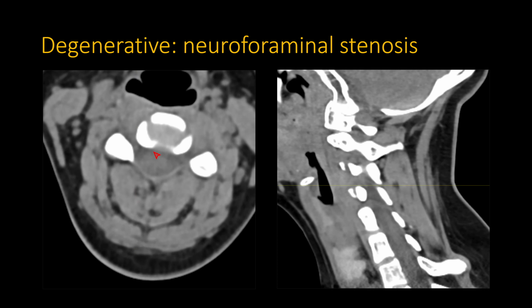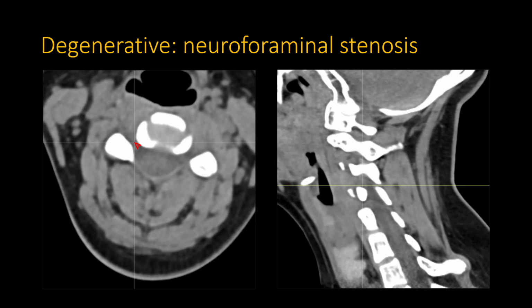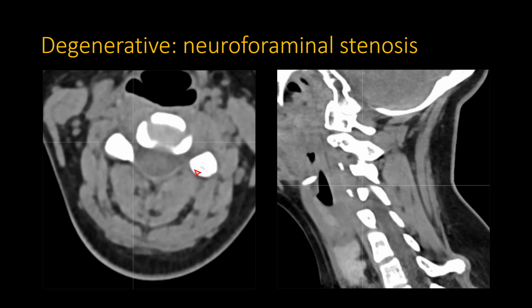So what you can do is make an oblique sagittal reconstruction that goes precisely through this neuroforamen like that, and then follow it up with another oblique reconstruction through the neuroforamen right here. I can show you how this would work on this PACS, for instance. Again, each PACS is going to be different. Here in this PACS, you first put your cursor on the center of the neuroforamen. This would be the fulcrum when you're doing 3D MPRs. Remember, on these PACS you can do 3D MPRs. So then you do 3D MPRs here.